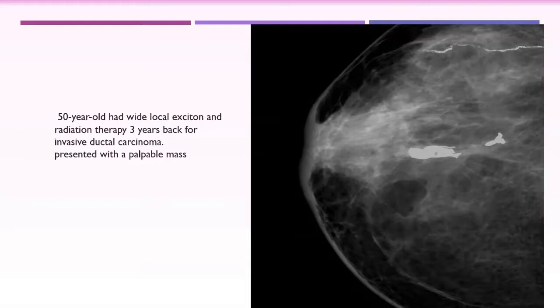Here we have two calcifications, but each is more or less a large homogeneous opacity. If it gets fragmented, that means there is underlying pathology making this dystrophic calcification fragmented instead of compact. So it will be suspicious. It will be signs for recurrence.